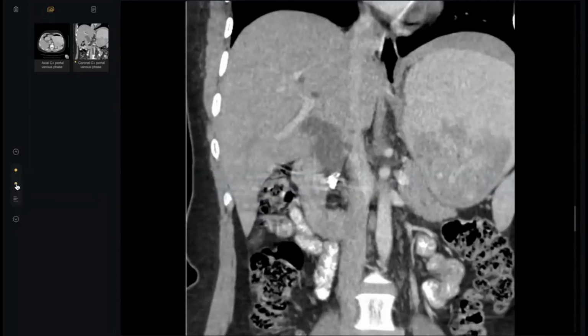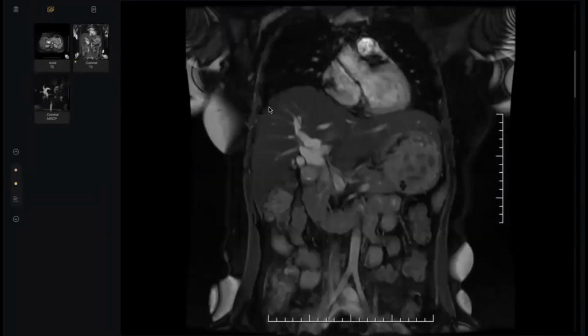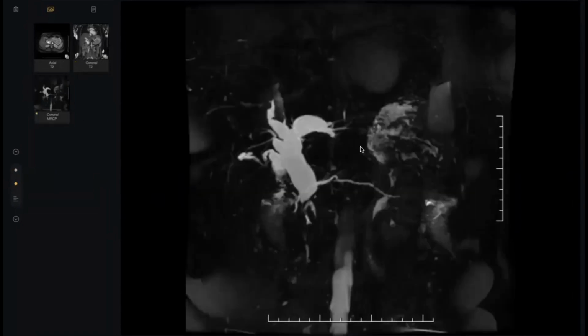I can put differentials in this case. It could be due to some mass in the pancreatic uncinate process, or it could be due to calcification in the pancreas, which could be a sequel of chronic pancreatitis. Chronic pancreatitis is correct.